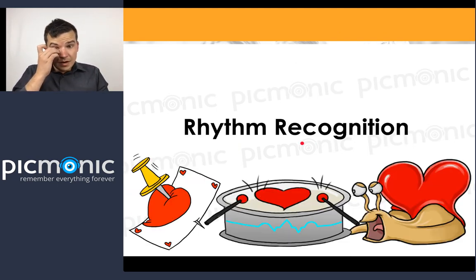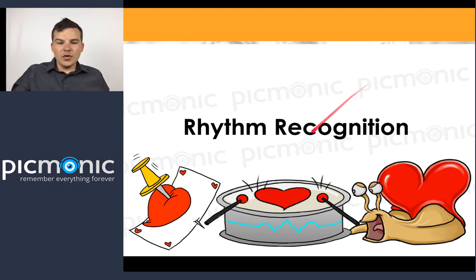So all of that, lots of basics, lots of things to understand. I get it. If you don't understand all of the basic stuff, I recommend making sure you really know that. But number one, you've really got to know how to calculate a good rate. That's super important. You've got to be able to calculate a rate, get the rate correct, and make sure that it is indeed working. That's definitely one of the things you just have to know. We're going to go through some rhythms.